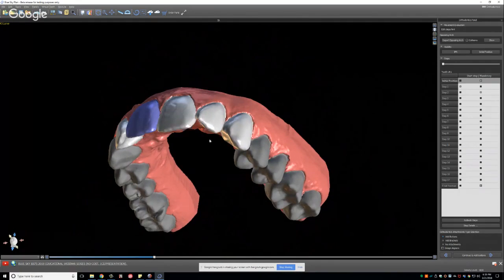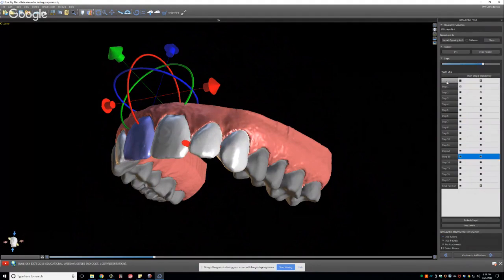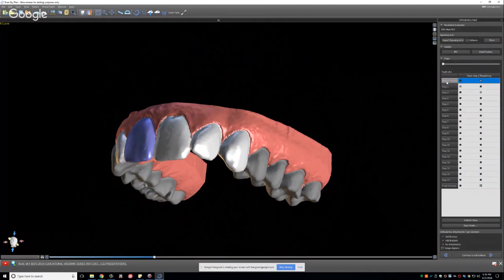This lateral, well, actually, it will need a button as well because of the torquing motion. It's not real severe, but right at the very end, if we want that to actually occur. The rotation, I'm not worried about a button. It's a big flat tooth. It's got plenty of surface area for the rotation. It's the sweeping of that root that's going to be more challenging.